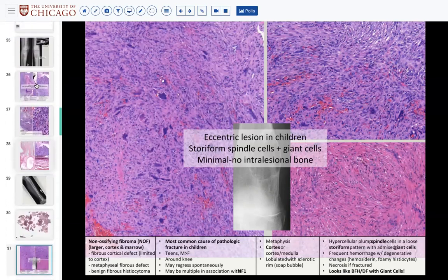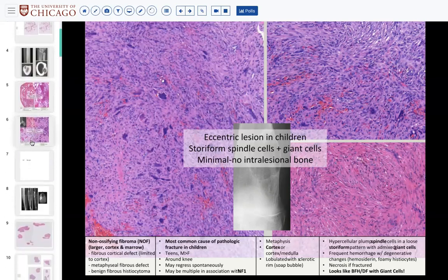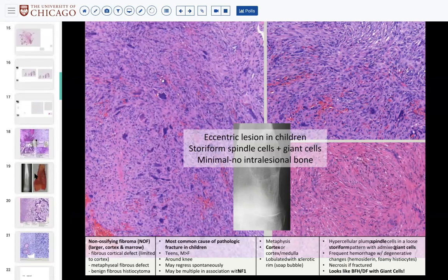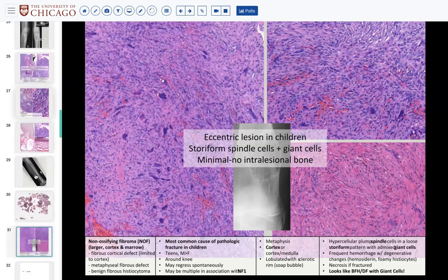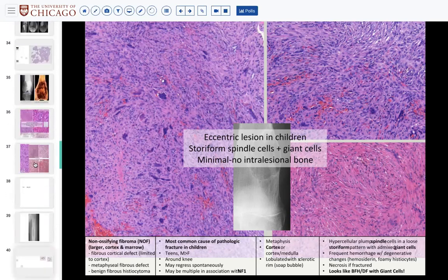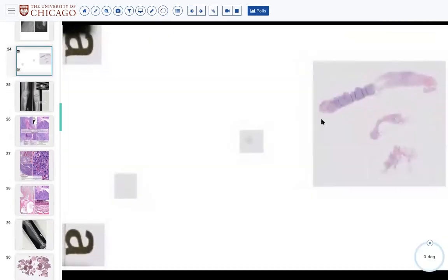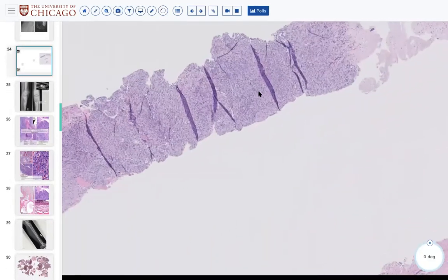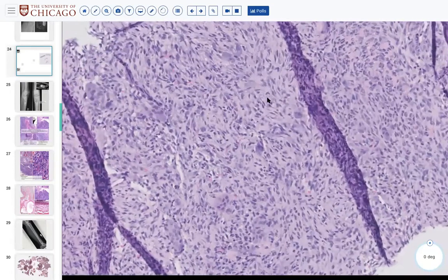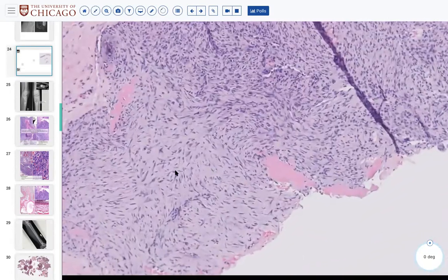Immediately after the talk, I will send out this full presentation so that you will have all of the diagnoses with the PowerPoint slides, and you can review them all in concert, and hopefully that will assist. Questions? Cool. Yeah, this was our solid ABC. So arguably a little more variability in the density of the stroma. The cells are a little more wispy, less tightly packed, but subtle differences.